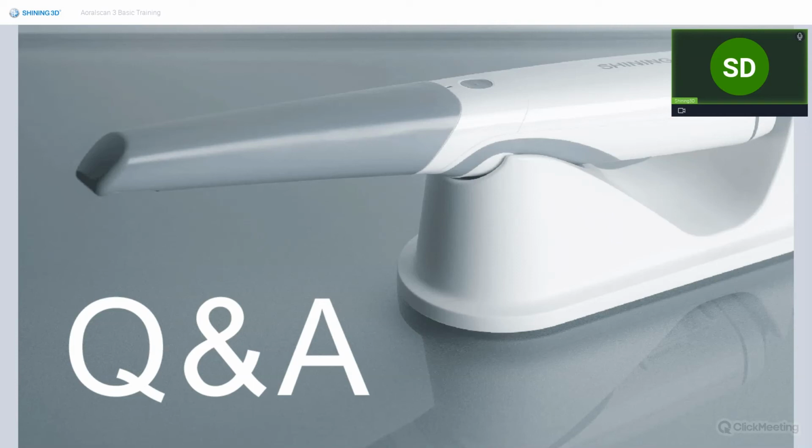Could you export the STL ready to print? If you are trying to use a third-party printer, you can just export the scan data and use other design software such as exocad to do the design and make the base, and that data will be an STL file.